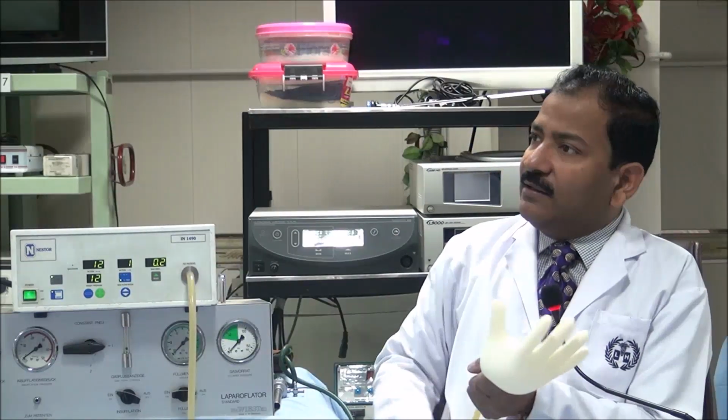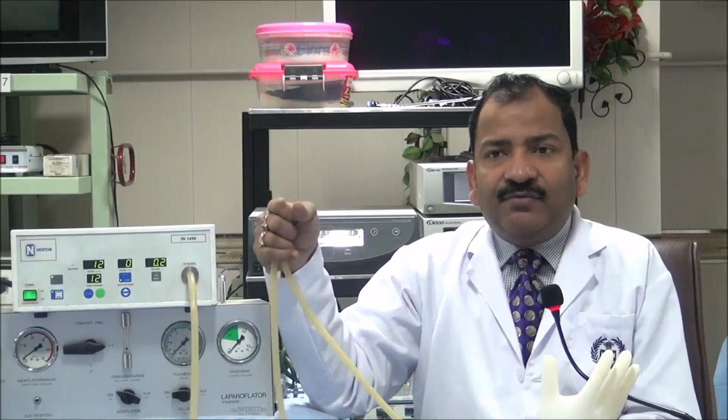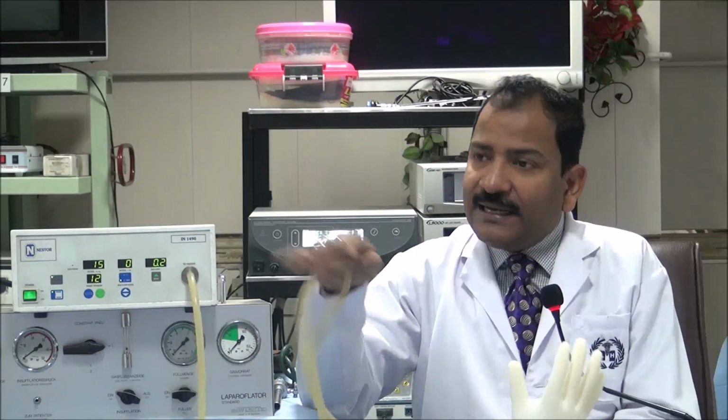It gives waves, and if there is any cavity, that wave is absorbed, and then it learns that there is some chamber. But if I bend the tubing like that, the wave which is coming will be reflected back, and the insufflator immediately recognizes that there is some obstruction, I don't have a cavity. Even though the gas is not flowing, it will recognize.